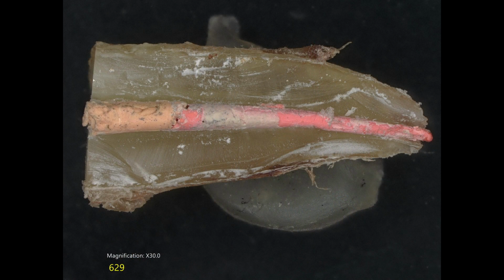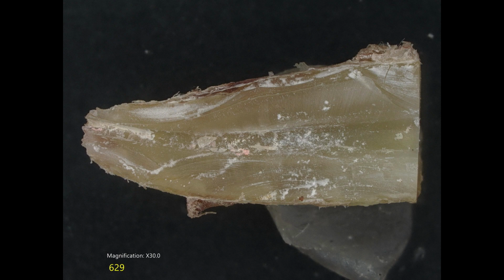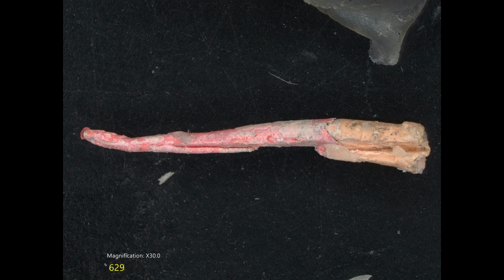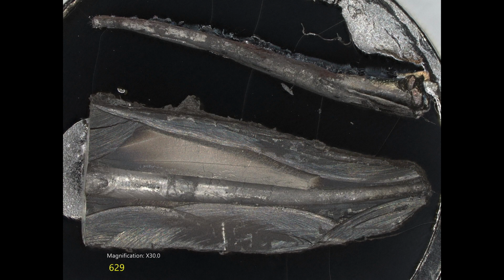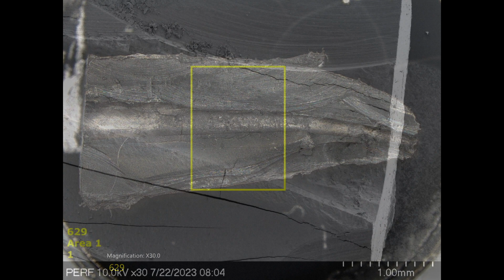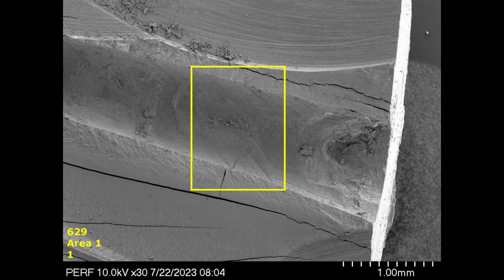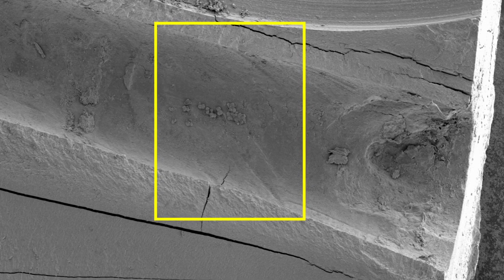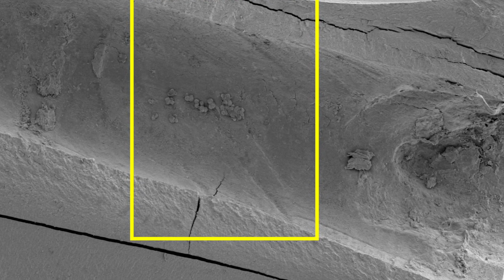The case looked extremely well obturated. After photographs were taken of both halves, we teased the gutta percha compaction out of the canal intact and then mounted everything on SEM stubs and sputter coated with gold palladium to a thickness of 10 nanometers for observation on a field emission scanning electron microscope. We examined a total of 30 areas and photographed 7 of those. In none of the areas were any microbial biofilms observed.